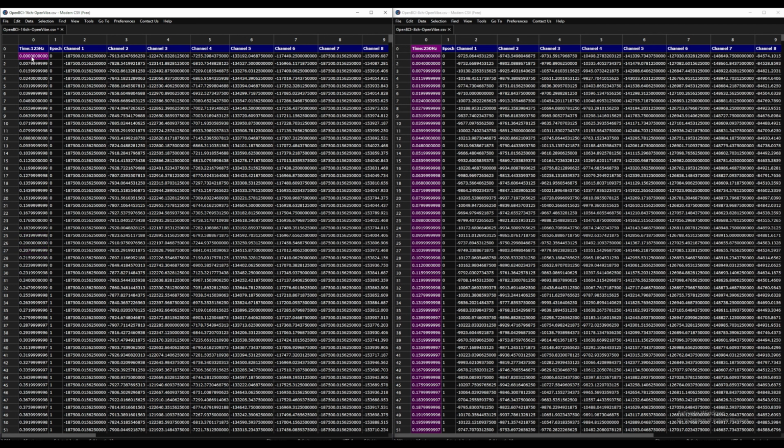But the ones in OpenVibe, they don't seem to correspond to the actual recording time because they're auto-generated for each recording. And I'll show that to you in more detail later. But that's good news for us, which means you really don't need to have a timestamp for your recording, and you can easily auto-generate it yourself for your own file.